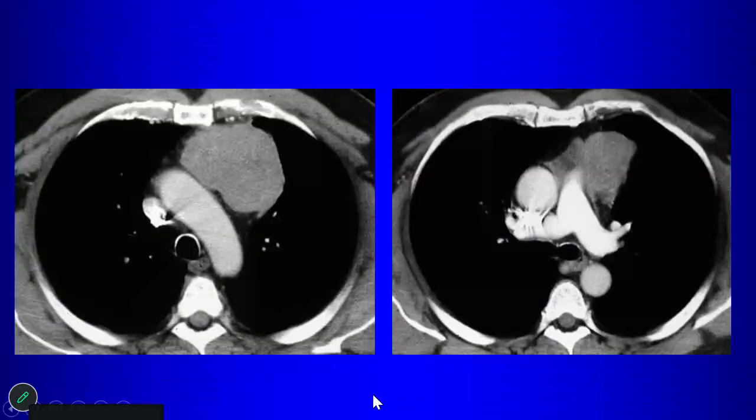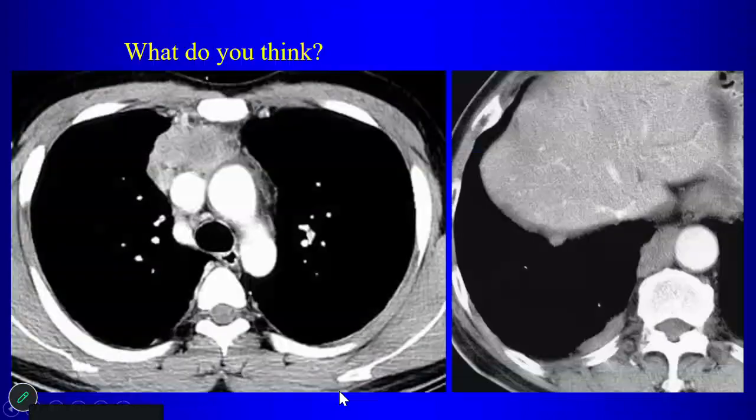So here's the CT on this case. We have this well-defined anterior mediastinal mass. If there's a clinical question you'd want to look into, what is that for this patient? Yeah, you'd want to know about myasthenia gravis. And this patient did have myasthenia gravis, therefore this is a thymoma, right? This turns out to be a thymoma. Again, those other things can be in the differential diagnosis, but with the history of myasthenia gravis, that's what you're going to worry about.